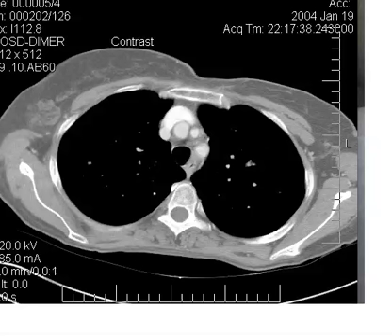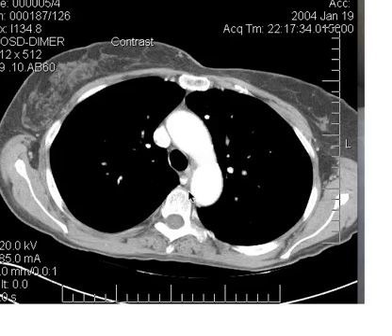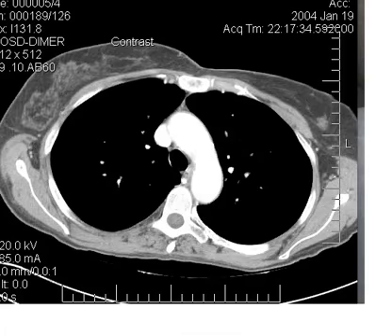Okay, now here we are in the superior mediastinum. We see the opacified left brachiocephalic vein coming to join the right brachiocephalic vein, and you see them merge to form the superior vena cava. Going back up, here we see the three great vessels: brachiocephalic artery, left common carotid, and left subclavian. Here's the trachea and the esophagus. We'll go down a little bit, and then we will see that we are in the arch. Here is the arch of the aorta.